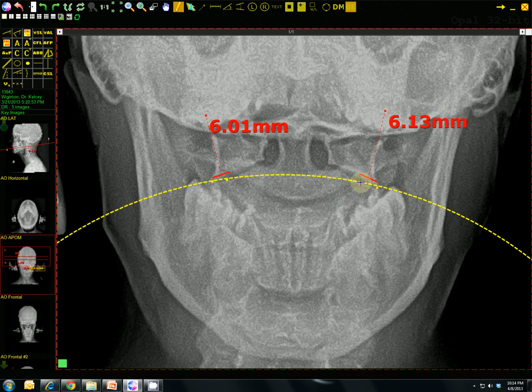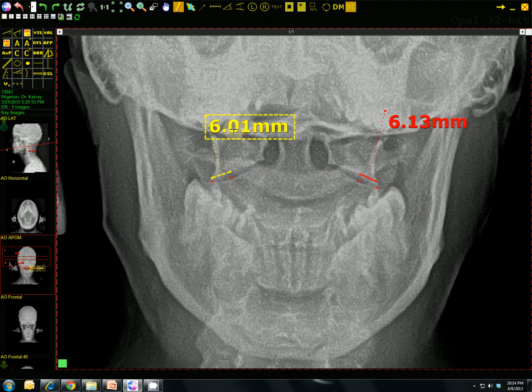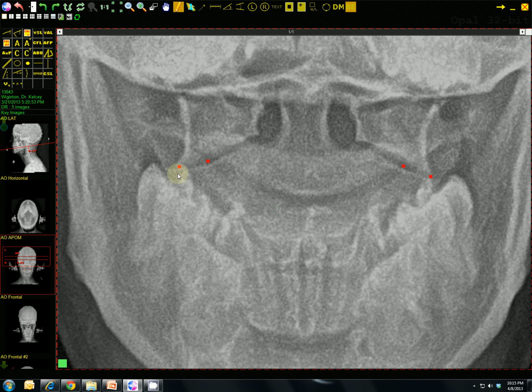So highlight this, bring it in to where it's up on top there, and same thing on this side. At that point I can delete these two references, as now I know that they are at least the distance they should be. However, they're not in the correct location, because they need to actually be just barely touching that surface. So this one can come down just a little bit, so that corner is now touching that surface.